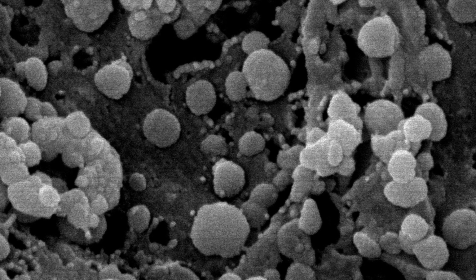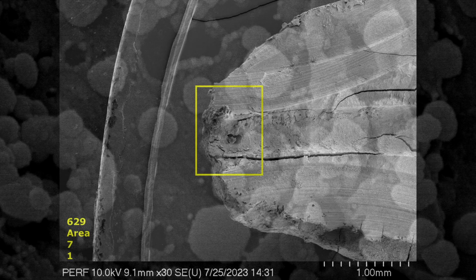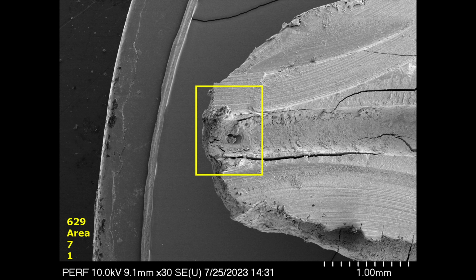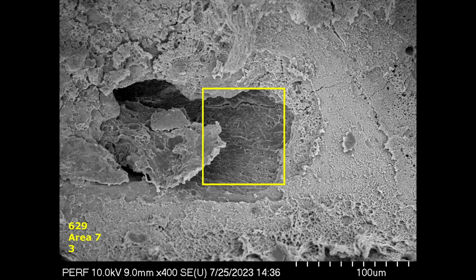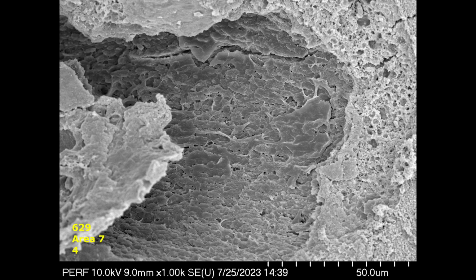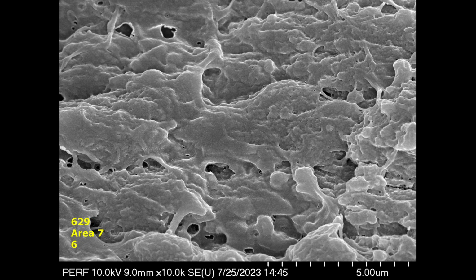Later on, in some other cases, we will examine yeast morphotypes and develop a better picture of what those communities should look like. In area 7 at the root terminus, again you see partial demineralization of the collagen substructure and how easy it is to mistake biofilm morphotypes for demineralizing dentin. Only by observing many demineralization cases and biofilms can one gain a higher level of confidence in the call.